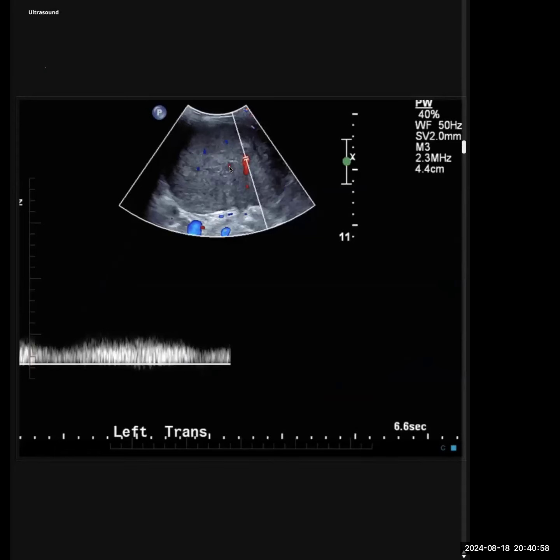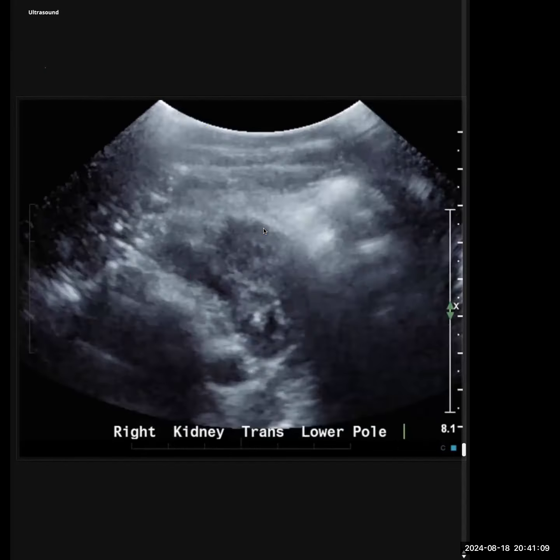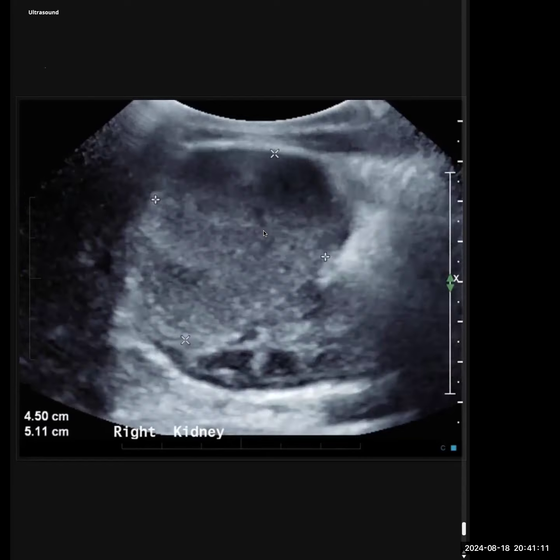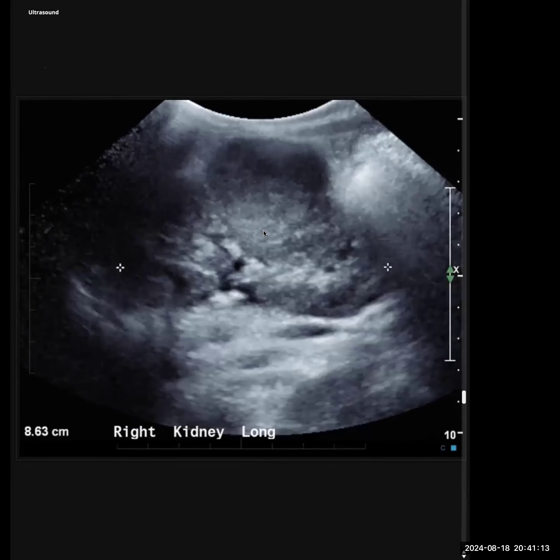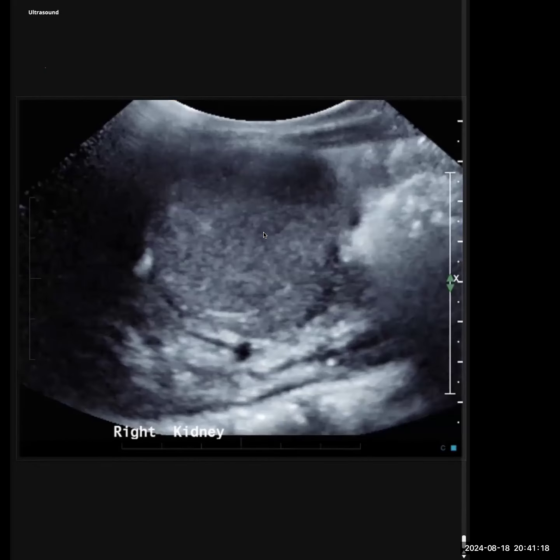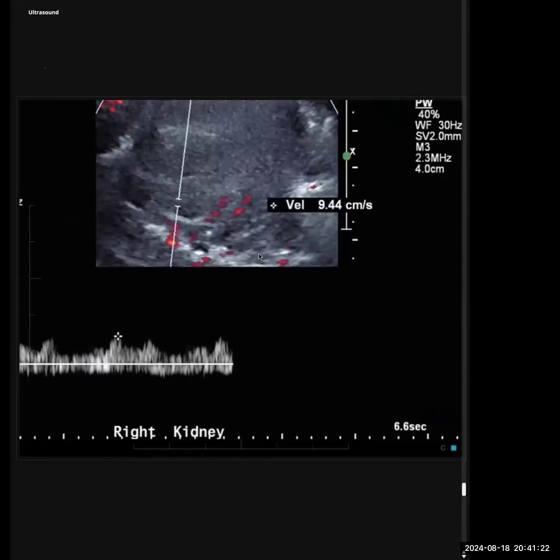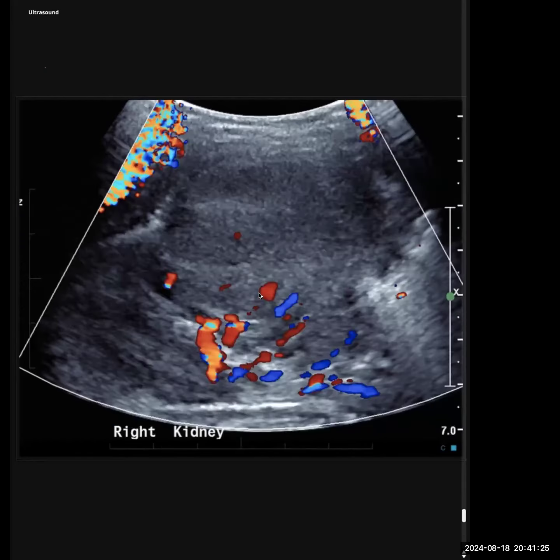But when you see the vascular images, just make sure that you make a comment that there is increased vascularity, which points to a more aggressive vascular lesion. And make sure you take a look at all the images they have given you, because while you were looking for staging and vascular involvement, the diagnosis is actually bilateral Wilms tumor. Had you seen all of that, you would have stated that you think there is a bilateral Wilms tumor, and that would have probably translated to a few more points, right?